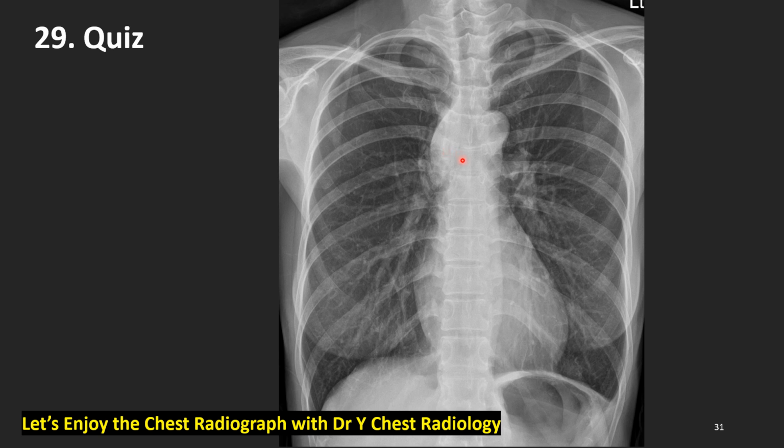What is your answer? What is this one? This is not a mediastinal tumor. Yes, correct. Your answer is correct. I respect you.